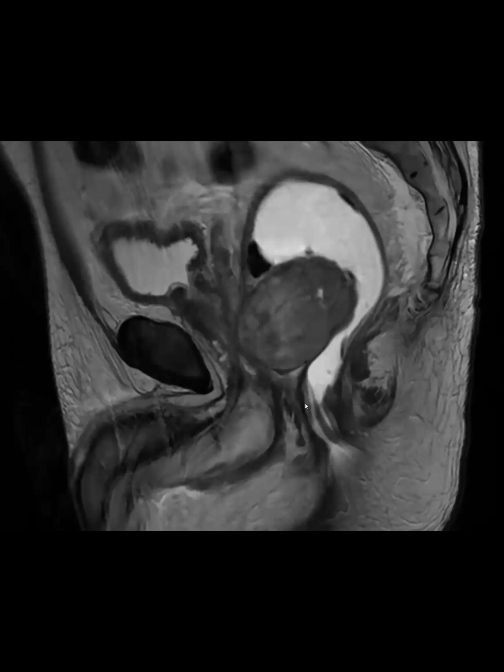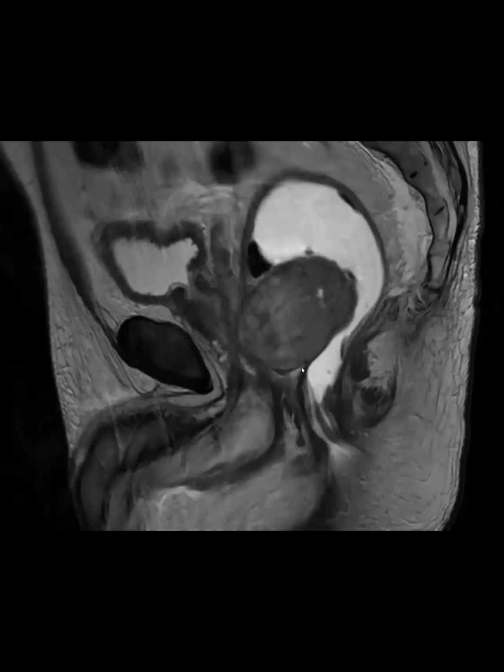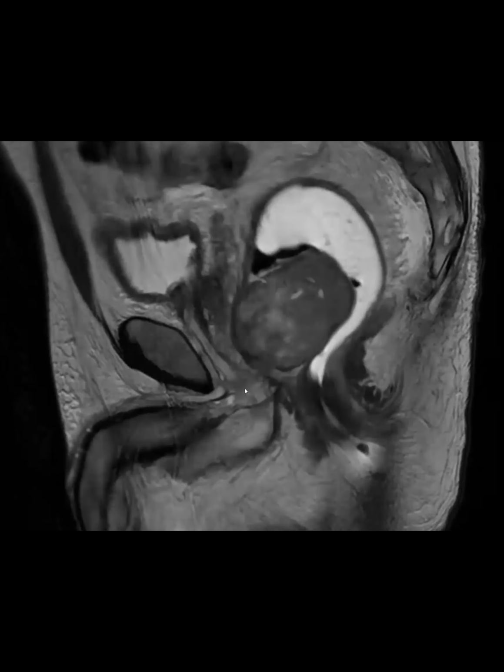So when you put it in the nomogram, it's actually a high risk GIST. The risk is based on the location, the size, and the mitotic index. So when you put all of those in, this is a high risk one. And also, rectal GISTs are tricky to resect because of their location. You can see how deep down it is. It's pushing on the prostate.